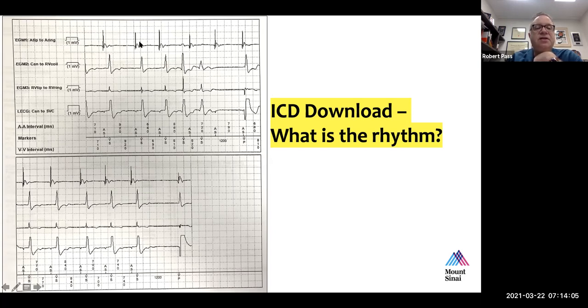The reason that we see this is because it is likely that the atrial lead has been inserted into the atrial appendage, the right atrial appendage, which is the most common location that atrial pacing wires are placed transvenous. And because the atrial appendage typically lies externally, it's sort of flopping over and extending onto the surface of the RV, it is not uncommon to see a small ventricular electrogram on the atrial lead as well.